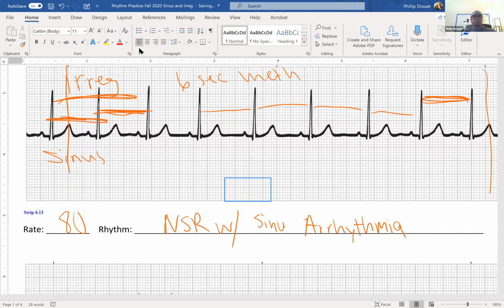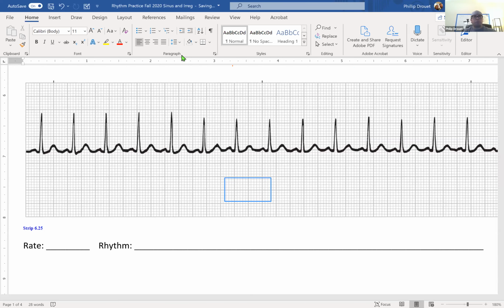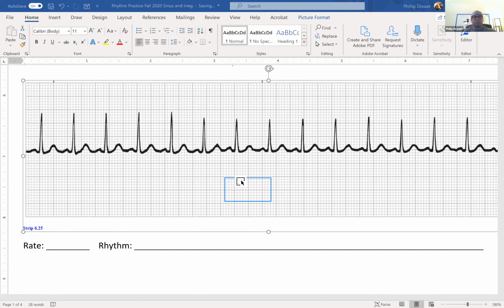All right, so let's move on through. Okay, and we'll just keep using this blue box here. So there we go. Let's grab one. Okay, we'll check for regularity.